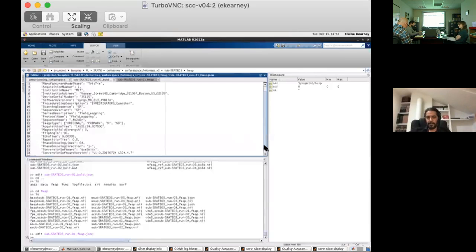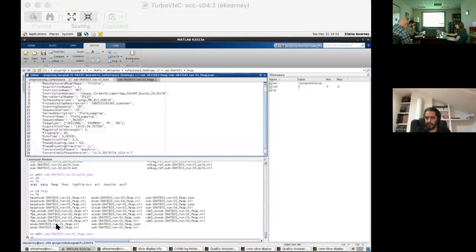The other thing is that we could go back to that tutorial, which unfortunately I use the same one. What is it? It's through MIT. I can bring it up here too. That one, it may be that we can pull stuff from there. Looks like it may not have everything we need.